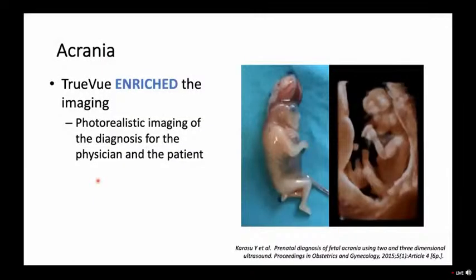This is not her specimen, but this is an image from an article showing fetal acrania in the first trimester. Here's our ultrasound picture of the brain outside the skull. Here's a post-mortem autopsy image of a first trimester embryo fetal brain. The cranium did not fully close, allows the brain to escape the fetal head. Everything else looks anatomically and structurally normal.